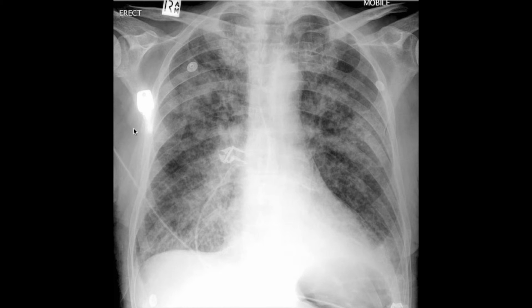Now for extra marks on this radiograph, I note a rather dense opacification in the shape of a key. This key-shaped object may well have been in the patient's pocket at the time of the radiograph. Now, in terms of the most striking abnormality, I think it's fair to say in this radiograph the most striking abnormality is the fine linear opacification throughout all regions of both lungs. This patchy opacification is partially obscuring the borders of the heart and can be seen throughout all regions.